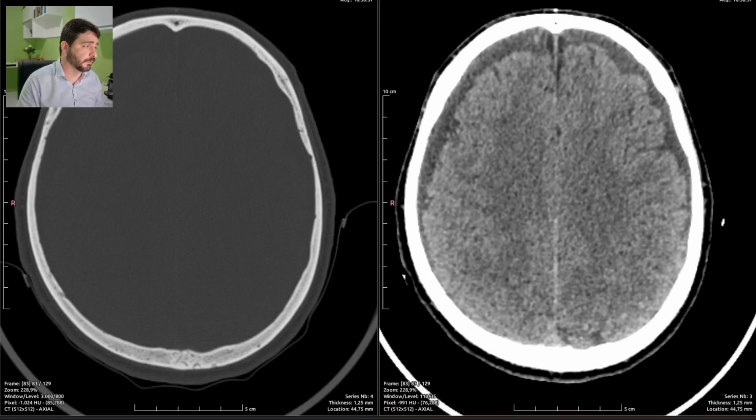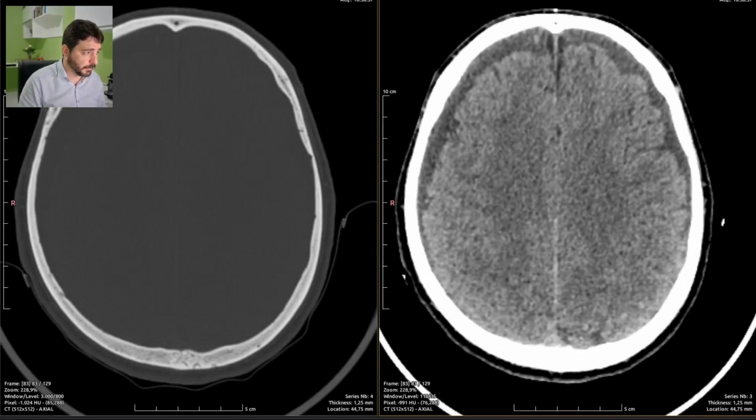So I'm going to summarize the report. Subdural collections, chronic subdural collections could be hygromas or hematomas, and tiny areas of hypoattenuation, which are usually microvascular disease. And we are done.